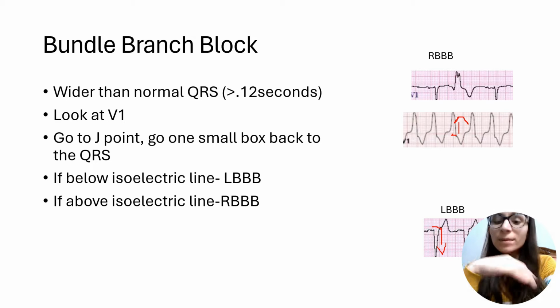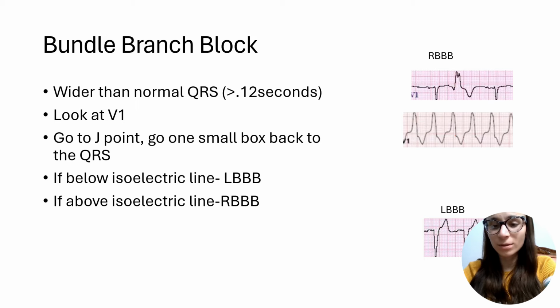Just in general, people like to say bunny ears. Sometimes a bundle branch block looks like bunny ears, but not always. That's why you don't want to rely on it, because you don't want to say it's not a bundle branch block just because there aren't bunny ears. A lot of times, as you see over here, you'll see bunny ears or an M wave with right bundle branch block, or a W wave with left bundle branch block. But you wouldn't want to rely on that because it's not always consistent. Just because you don't have it doesn't mean there isn't a bundle branch block.